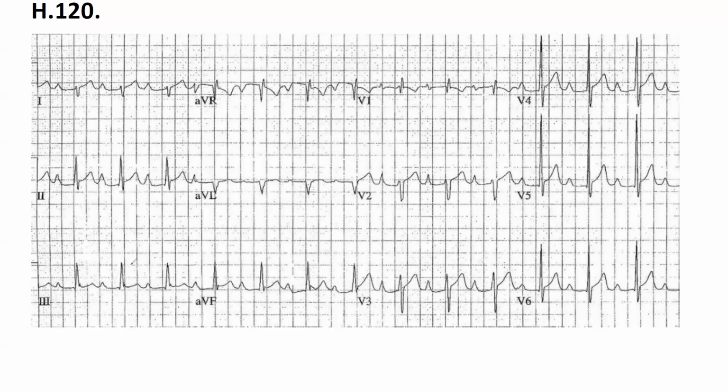How many squares do we have? Let's see, 1, 2, 3. Let's shift it, 3.5. So I think it's closer to 75 or 80, 90, it doesn't matter. Okay, good. Go on.